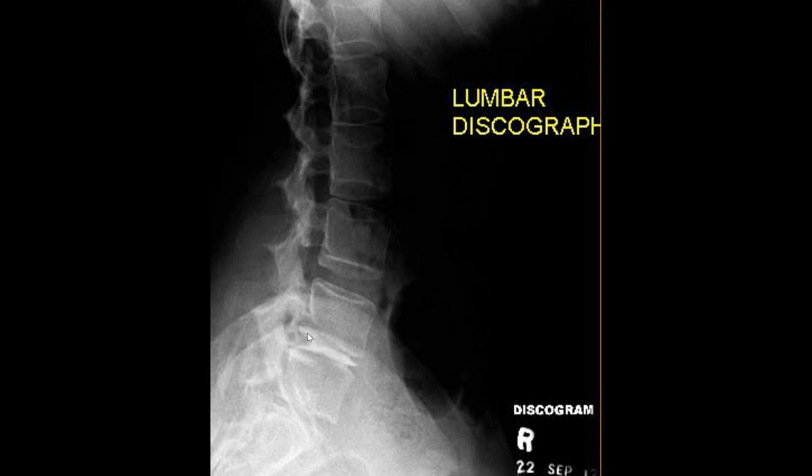It's not uncommon to have multiple levels of degenerative discs on MRI, for example, of which one may be a dominant pain generator, if any. So just so you're aware, it's nothing I'm familiar with personally, but it's prevalent in the pain medicine world. Provocation discography. Here's just a discogram for reference here. Injection of dye into the intervertebral disc. Now, patients will be awake during the procedure and they're going to give real-time feedback. And it's not looking for pain reduction. In fact, you're looking for pain amplification or reproduction.